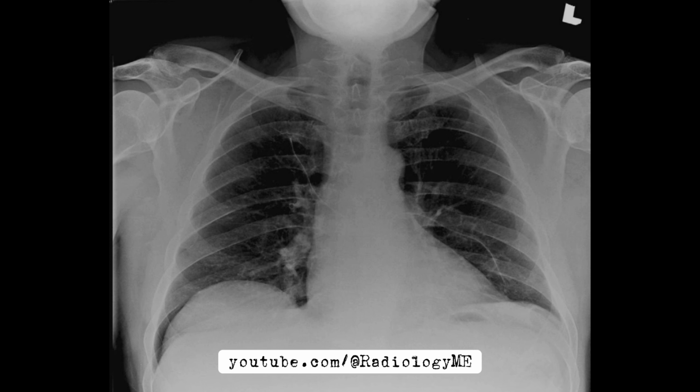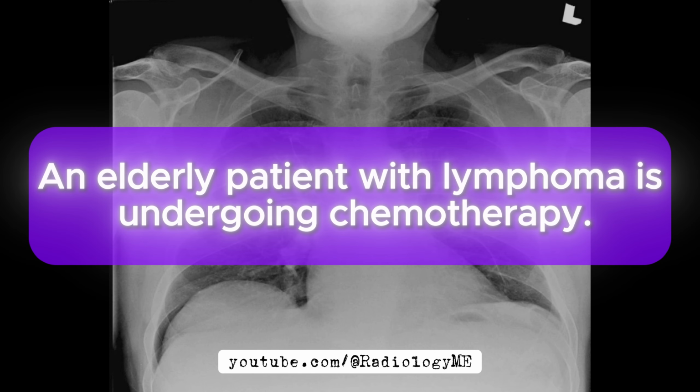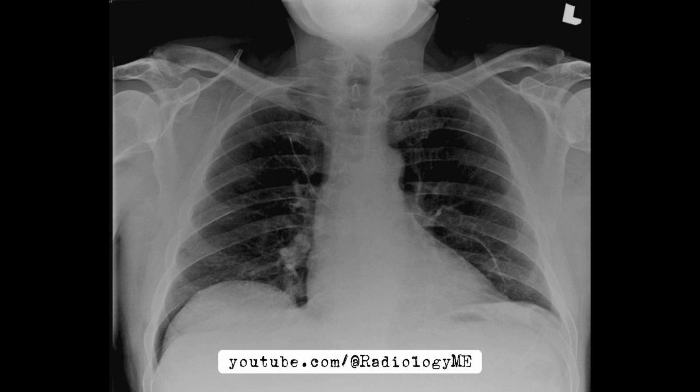So here we've got a really interesting case, an elderly patient with lymphoma undergoing chemotherapy, and we're being asked to evaluate their response to treatment. Now, you might wonder how we go about figuring that out, right? It's all in the imaging and the clinical signs. So let's break it down.